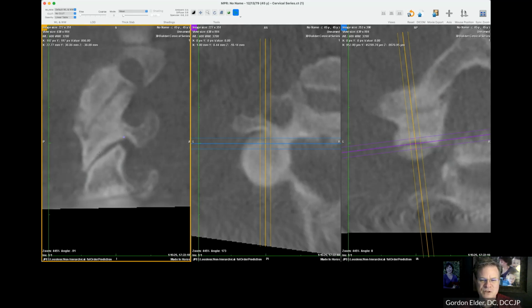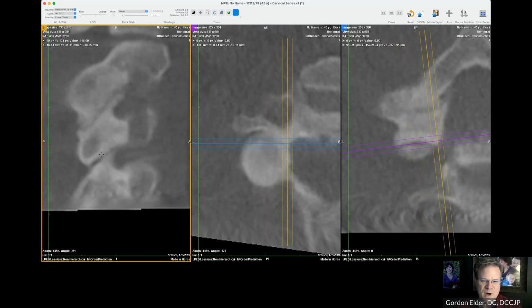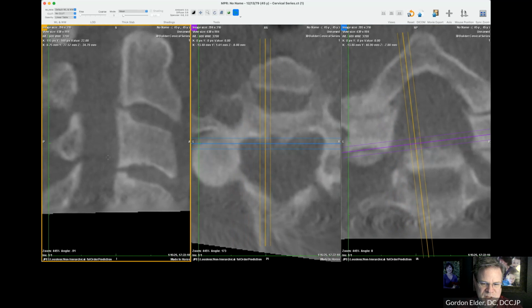I mean, an anterior wedge. So if we can't see the gold standard, we're going to take our clues from other things. The next one is looking at the parasagittal George's line.